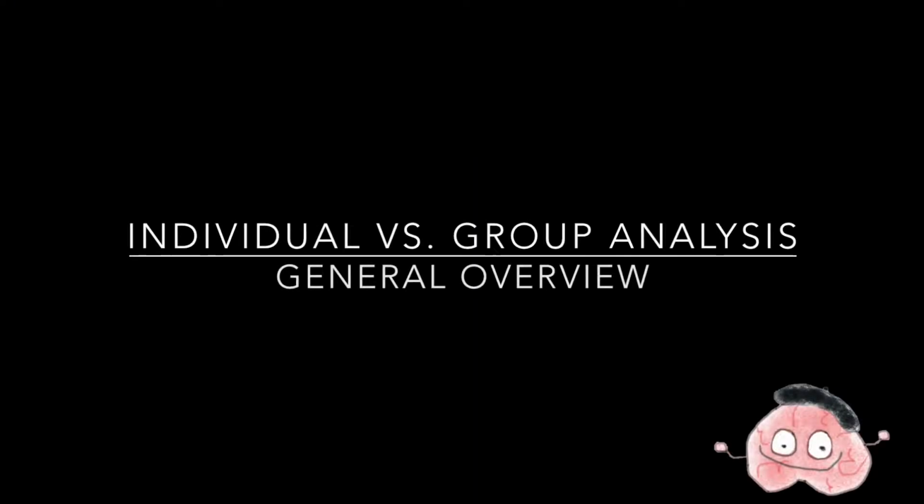If we compare an individual subject to an average group dataset, we will notice more voxel activation in the individual. Averaging participants together removes individual idiosyncrasies, resulting in an average pattern of activation. This will reduce the overall activation. Depending on your specific purposes, these idiosyncrasies may be of value to you.